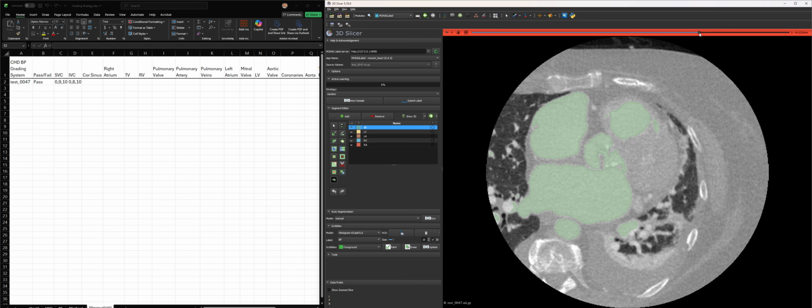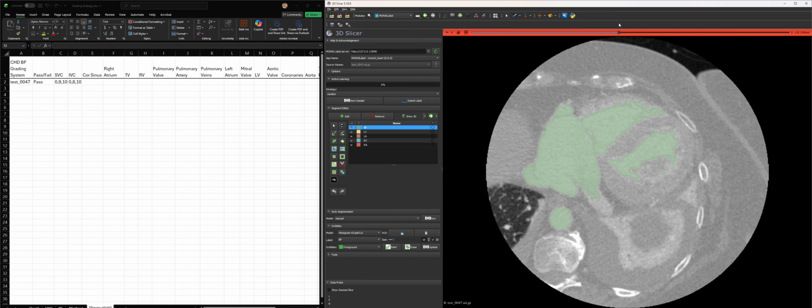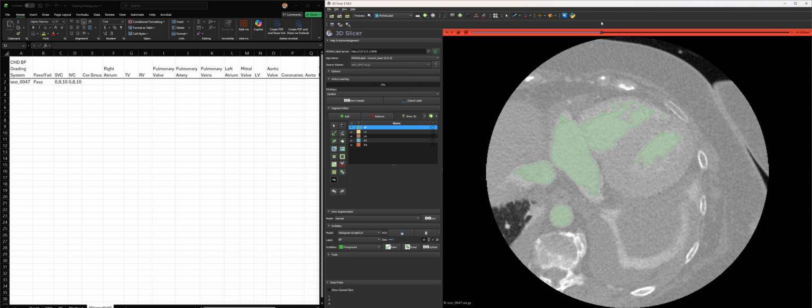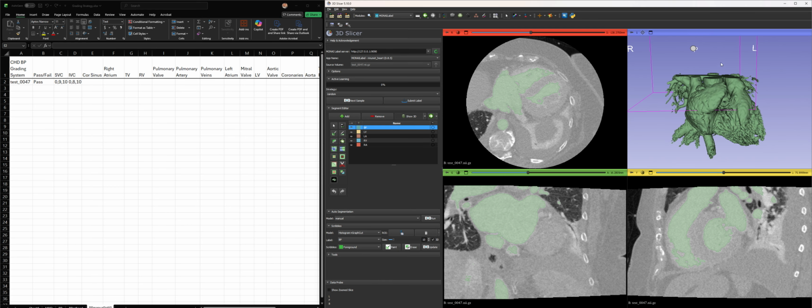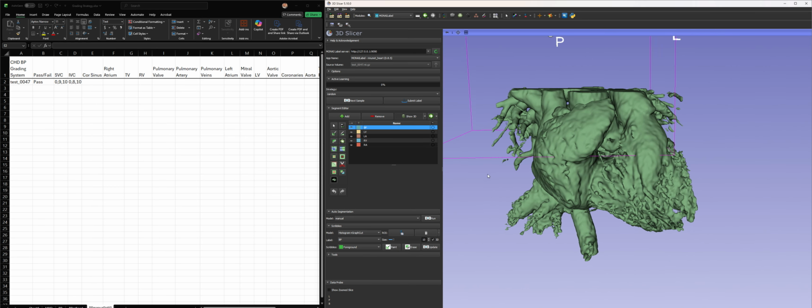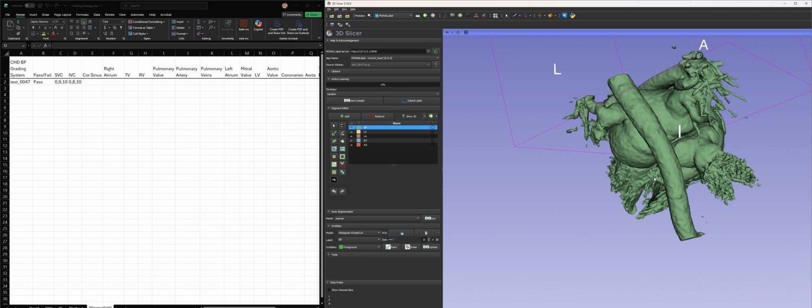It looks decently demarcated, I guess. I'd probably give it a max of about 8, and then I would score it 2, because I just got really at the mouth here. So coronary sinus, and so on the pass fail, let me look back over here. I'm going to say fail. If I saw a little thing coming around here, just evidence of it, I'd pass that. And because it's absence, that's going to be -1, 2, and 8, I think is what I said.